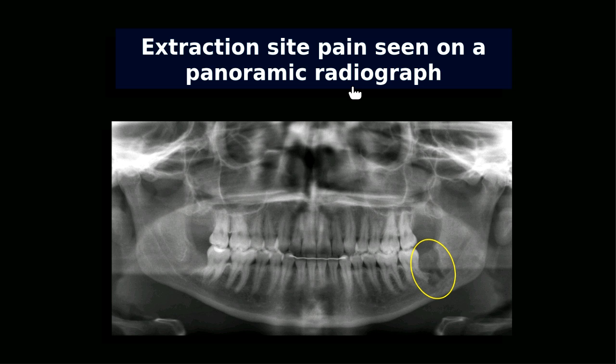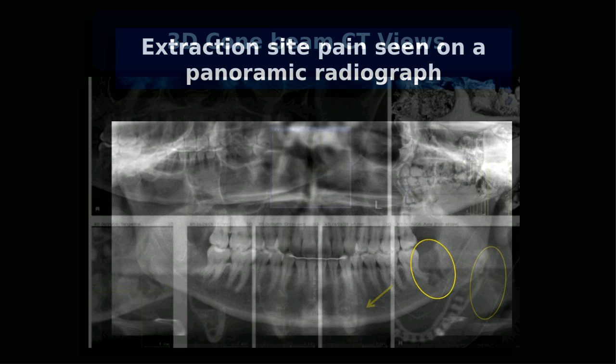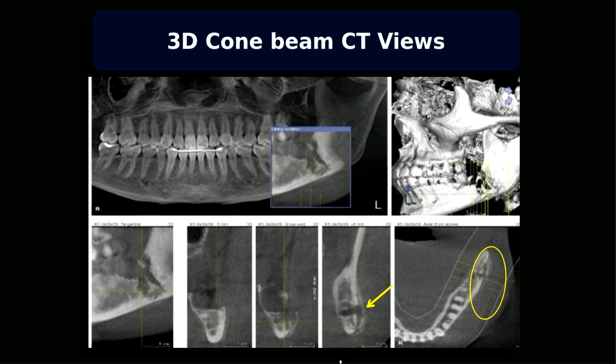And here we have a patient who underwent extraction, and on the pan you cannot see much, but the patient has pain and they want to see what's going on in that area. So we took a CBCT scan after 2-3 months, because the patient came back and said the pain is not going away and it's very painful. When we saw that, we saw a fracture line which goes all the way, and it became chronic, and you can see the extra bone or periosteal new bone formation.